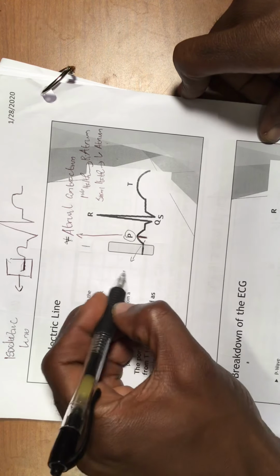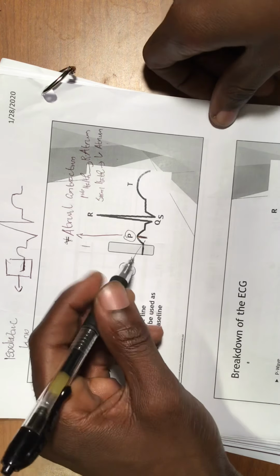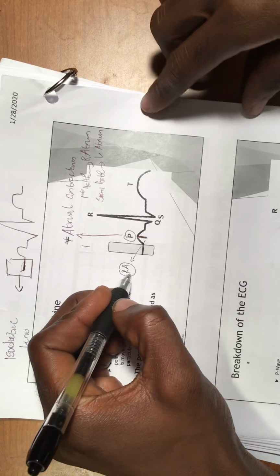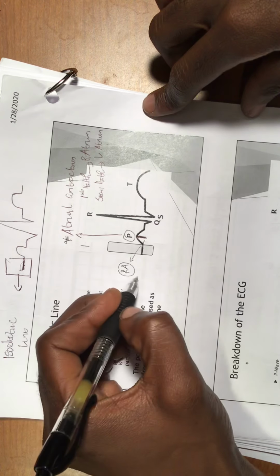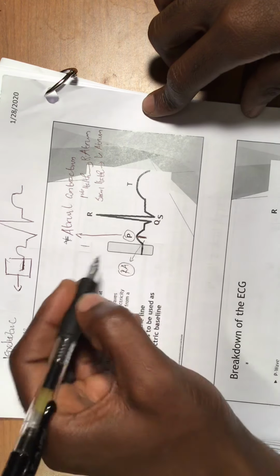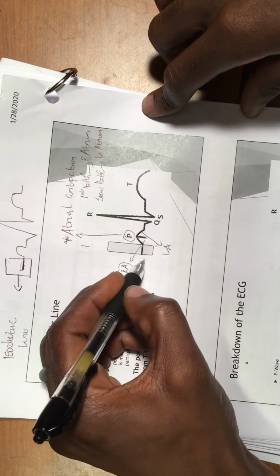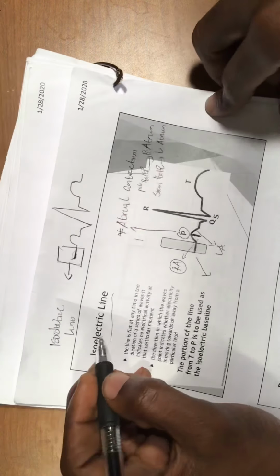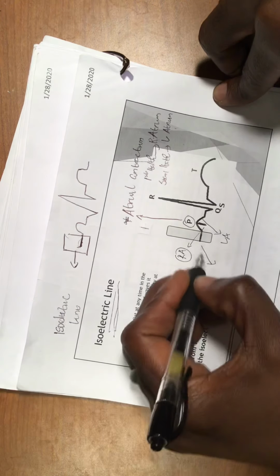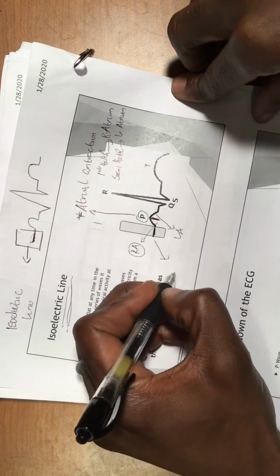So you have the first part of it. This is the right atrium contraction, because the SA node is in the right atrium, so the SA node is going to give branches first to the right atrium. So this is the reason why the right atrium contracts first before the left atrium, and this is the left atrium. And before this P wave we have a line, so this is very important. I put it right here, if you can see it. This is the line before the P wave, and we call it the isoelectric line.